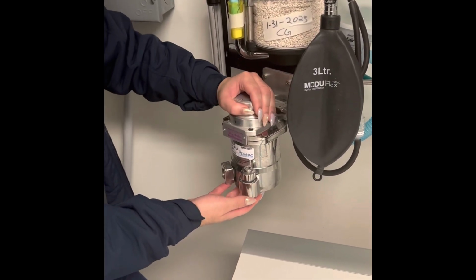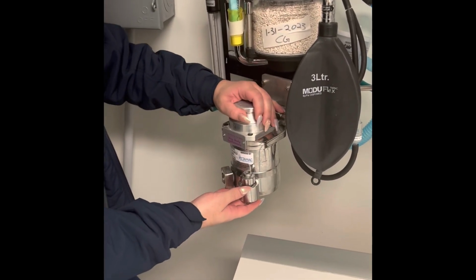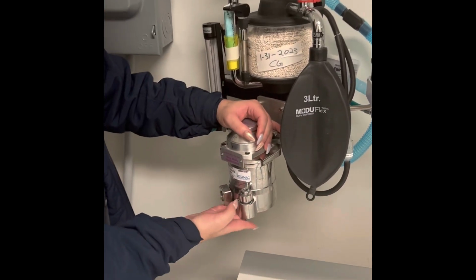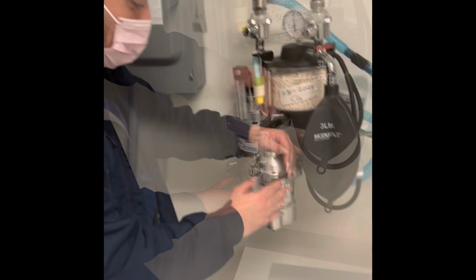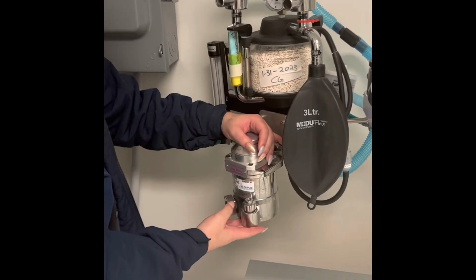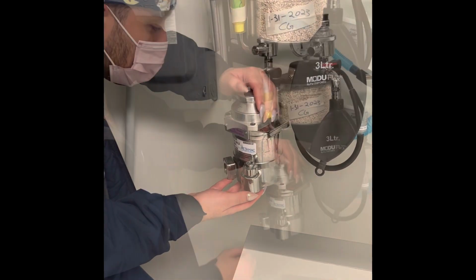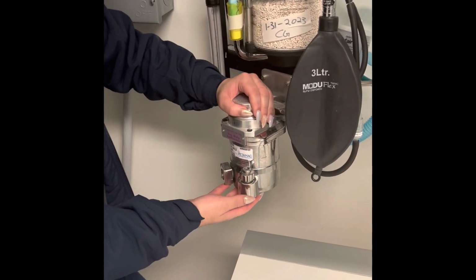And here we have our vaporizer, which the oxygen travels through and converts our liquid anesthetic into a gas for gas anesthesia delivery to the patient. Our vaporizer here is a precision vaporizer, because I'm able to control the percentage or amount of anesthetic gas that is delivered to our anesthetized patient.